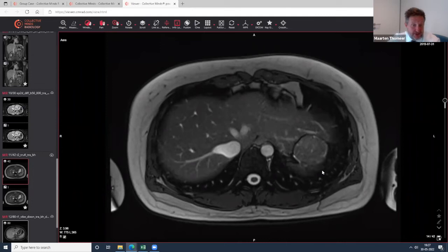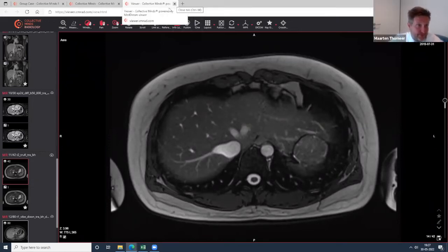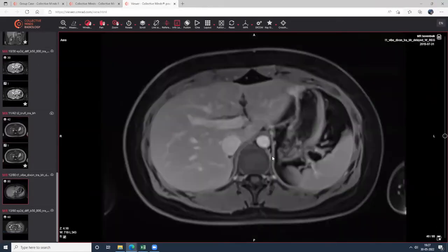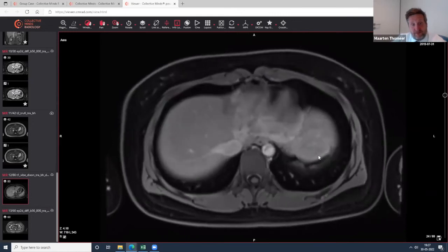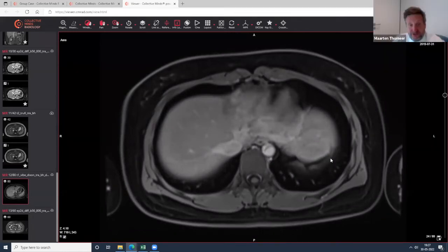So my diagnosis would be an FNH or adenoma. Do you agree? It is a proven FNH indeed. I think on the delayed phase you can see some enhancement centrally in the lesion. Yes, I agree, but you can also have vessels around the scars. And the problem with adenoma is that sometimes you also have enlarged vessels in the tumor.